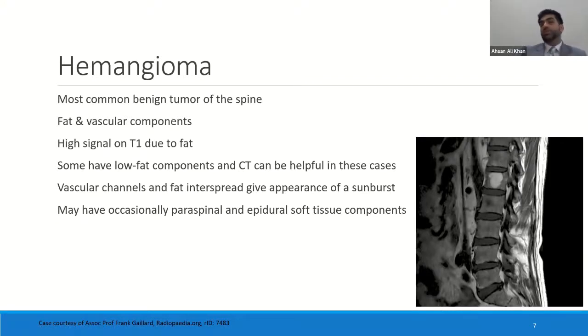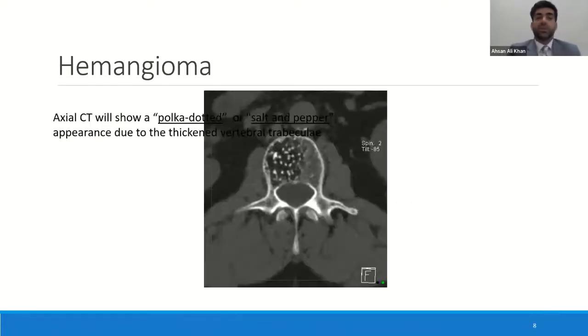You don't need to worry, because tumors usually will not be bright; they will have hypointensity because they replace the bone marrow, okay? So when they have this hyperintensity, high fat content, you can be relaxed that it's a benign tumor. When they have less fat, low fat components, and we are not sure whether it's a hemangioma or not, that time the CT comes in.